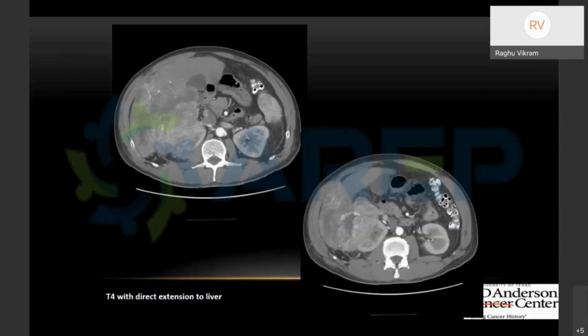The liver is another organ commonly near right-sided renal tumors. It almost looks like it is being involved. Sometimes it is just being distorted and is not really involved. You need to be a little careful. Sometimes what we do is look at the vessels and see if the vessel separating any part of the tumor is a branch of the hepatic artery or any of the vessels supplying the liver, and that is more useful for telling whether the liver is involved or not.